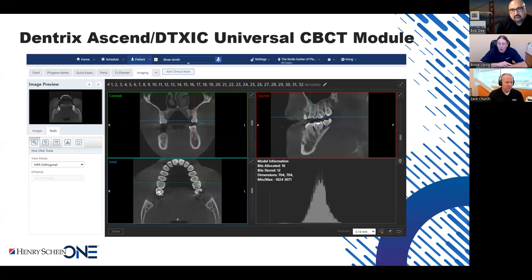When it comes down to implant planning, airway analysis, and some of the fine, exciting tricks, we look at those as being very, very important to the oral surgeons and very, very important to the specialists, which is the reason that we take our three-dimensional imaging module as a viewing and diagnostic module. It doesn't have implant planning capabilities built in for two reasons.